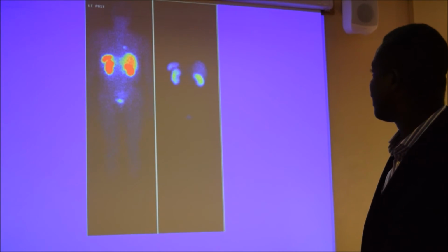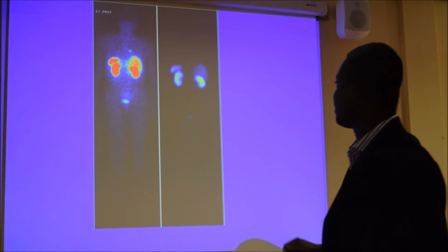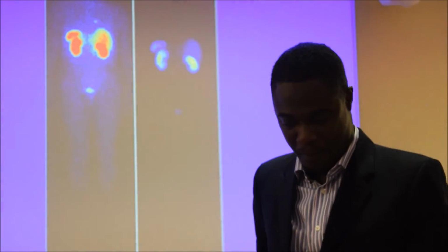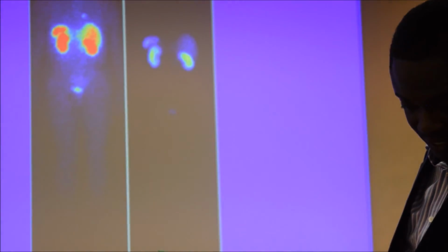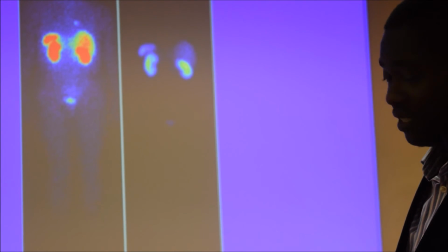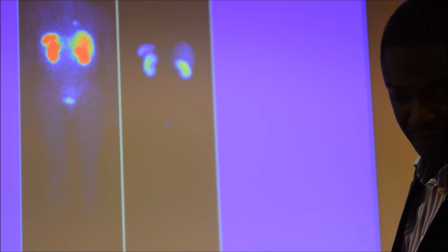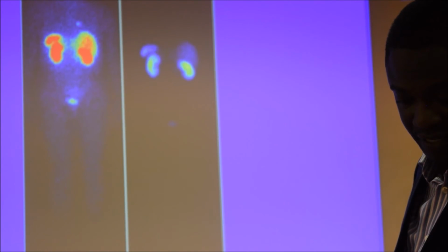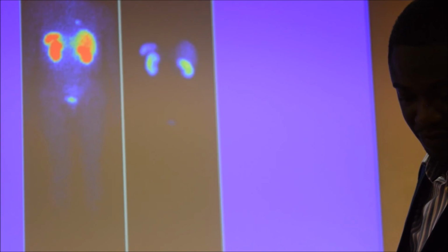This patient had a PET scan. This is still an octreotide scan. It shows the lesion there. And we can see on this one that it's just a solitary image in the lung. It's a benign solitary mass in the lung. It's a benign lesion. After surgery, the patient is not going to need anything else. Surgery is going to be curable.